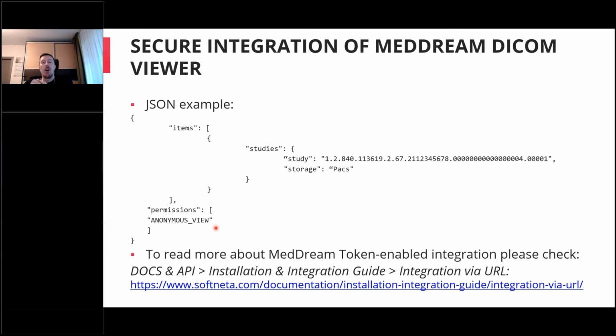So I don't know how many of you tried this token enabled integration. Maybe for some of you it's very scary, but it's not, trust me. And if you want to read more, check our installation and integration guide, and check the integrations via URL. Here we have all the documentation with the workflow, with the examples, so you can always check it.